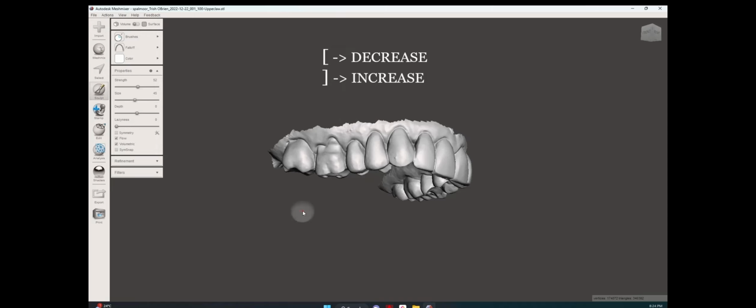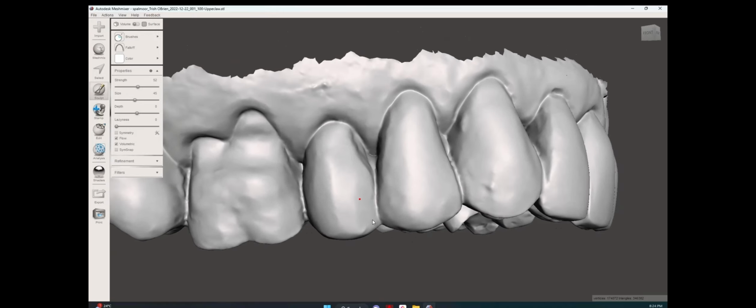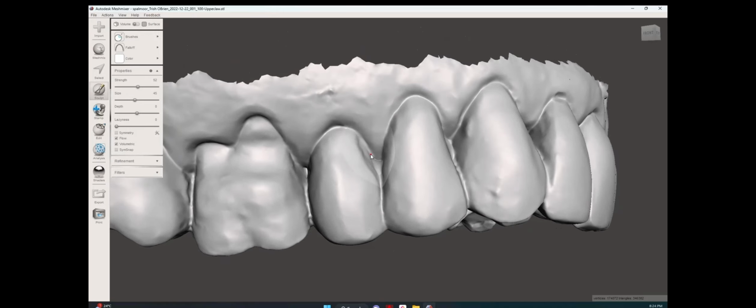So let's quickly do a survey and zoom right in to make it simple. Okay, we want this area here. There's a clear undercut here, and that's about the size that you want the bubble to be. It fits right there. Now it touches the interproximal area. That is not an important area for the orthodontic movement. We do not push in that area, right? We push on the buccal area. This area here is just an undercut.